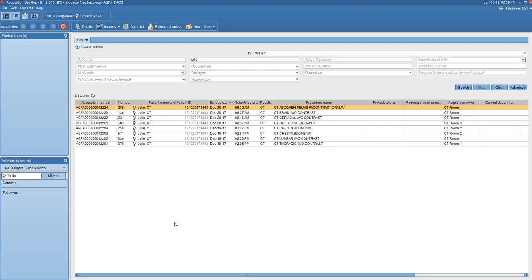Okay, today I want to talk about CT image quality, and really what we're going to talk about today is just how to identify CT images and how to identify structures in CT images and what CT images look like. We're not going to become radiologists, we're not going to learn to diagnose things in PACS, but I just want to give you an idea of what a CT image looks like and some of the basic anatomy and how to navigate them. So let's start with the brain.